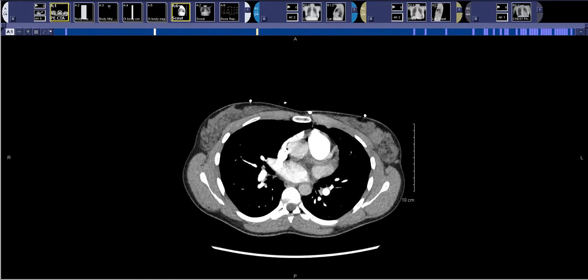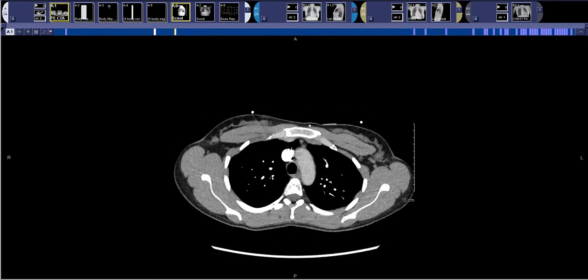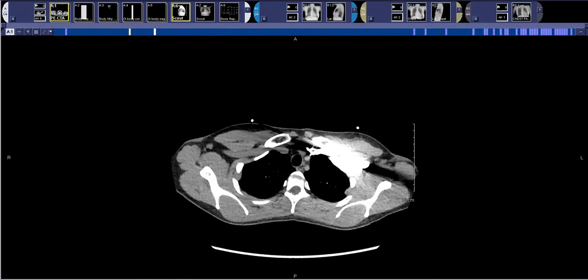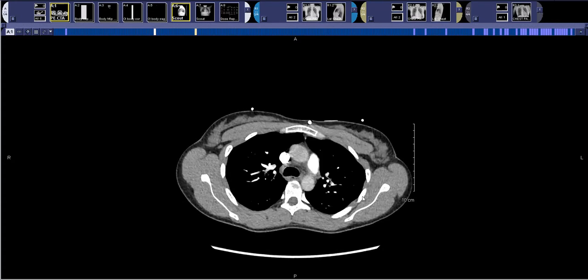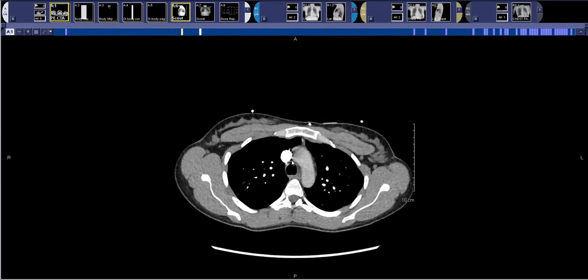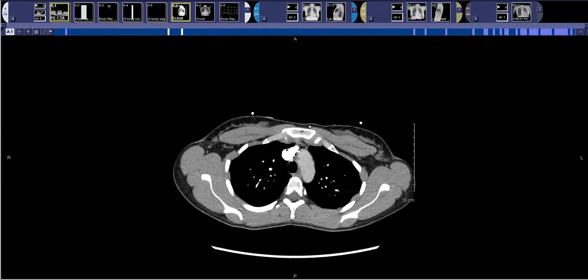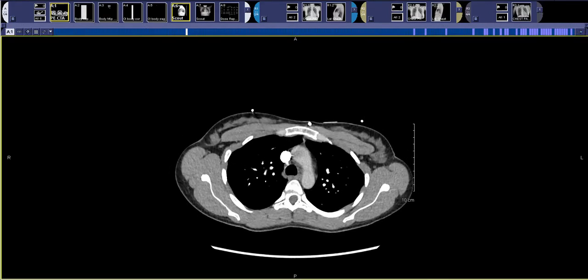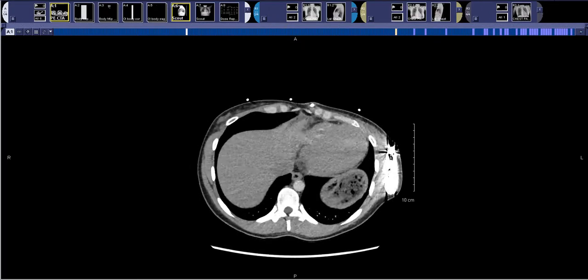After I've finished looking at all of those, then I'll be done looking at the pulmonary artery on these axial images, but I will come back to it on the maximum intensity projections. I finished looking at the heart and great vessels. You'll get variable opacification of the aorta, but it's worth looking if they're having chest pain. Make sure it doesn't seem like they're having a dissection or anything.